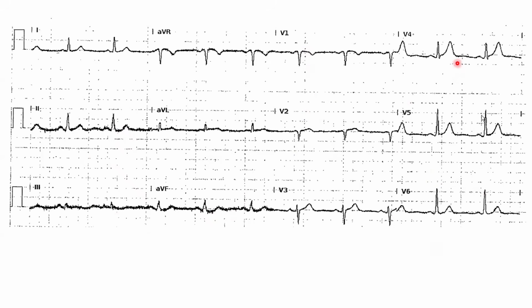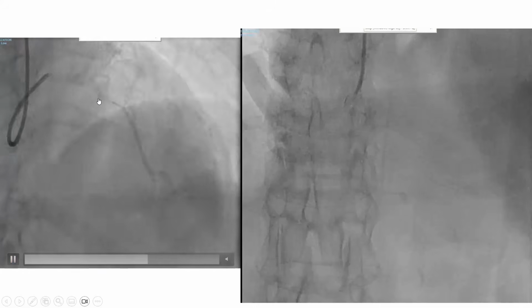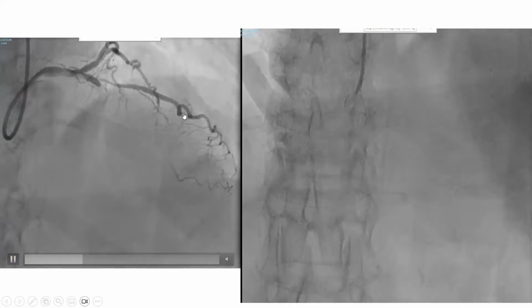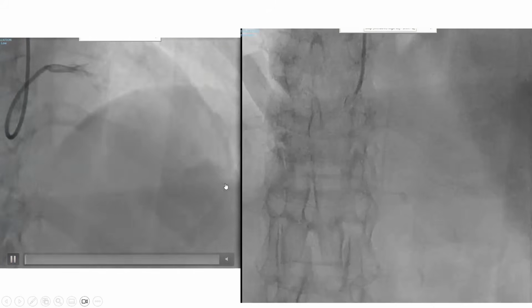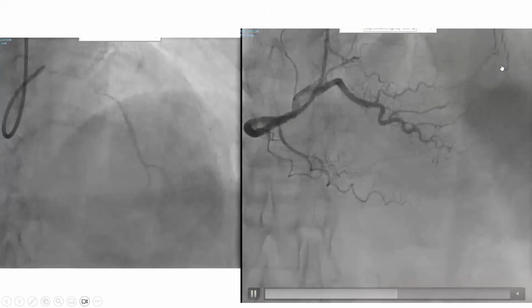And you have a wide T wave in V4 and a relatively tall T that approximates the size of a shrinking QRS. Also in lead V4, you have that S wave being pulled above the baseline by the ST. So all this is suggestive of a STEMI. This patient was taken to the cath lab, and indeed she had 100% occlusion of the LAD just before a large first septal. And she had CC2 and grade 3 collateral from a large first diagonal branch, as well as from the RCA, as you may see here.